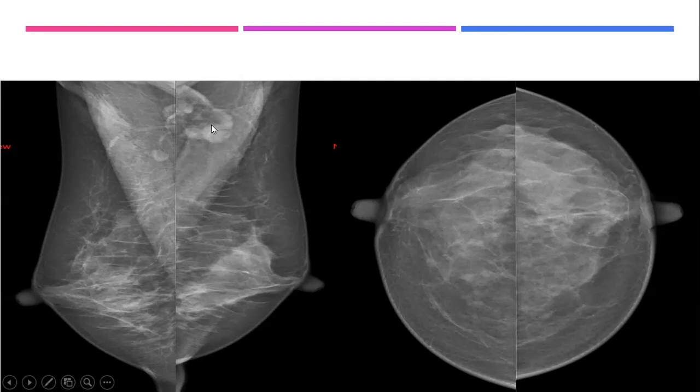Look at the asymmetric cortical thickening. See? So they discussed it, and we raised for them the probability of this being the site of the lesion corresponding to the CT findings. It was not convincing for them, but they decided to do a bone biopsy.